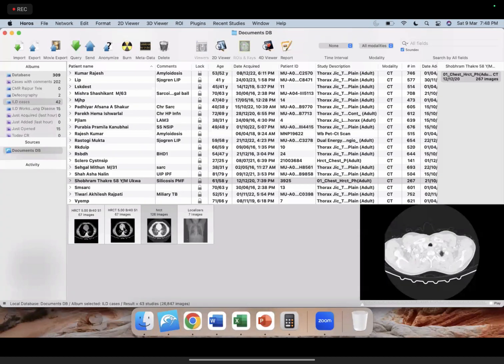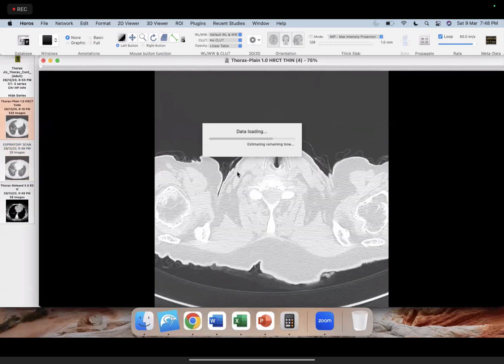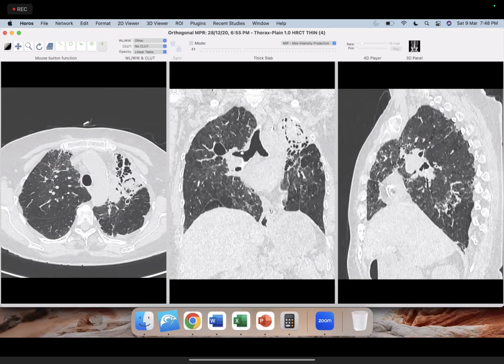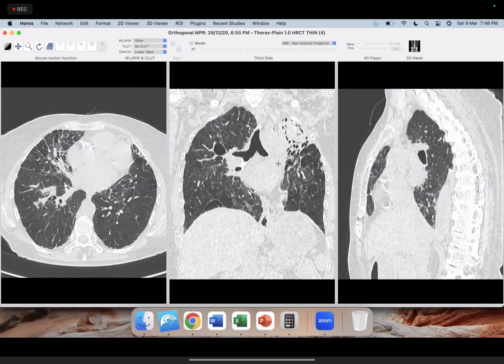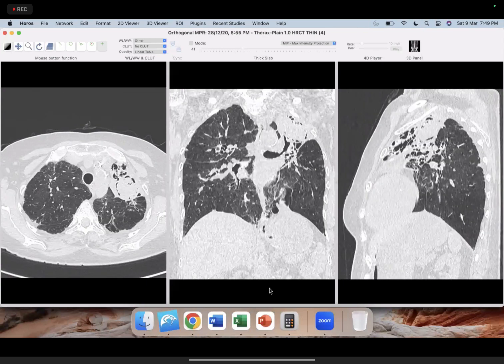And finally, just to show the importance of follow-up scans. So every time, like I said, once you have made a diagnosis, even on follow-up, you should not pay attention just to see whether there's a progression or regression, etc. You should always pay attention to the superadded complications. So what is this I'm showing here? If you have attended my previous lecture on infection, then you will label this correctly.